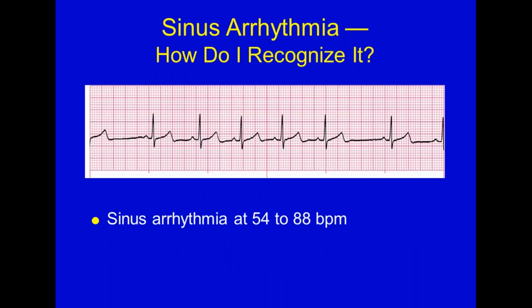But we just have, as you can see, from the eyeball test, these 5 complexes look to be the same, and then up here, we've got a little change. Does everybody see that? And then I don't know what happens after that. Maybe it stays slow, and that was the little blip on the screen, or maybe it speeds back up.